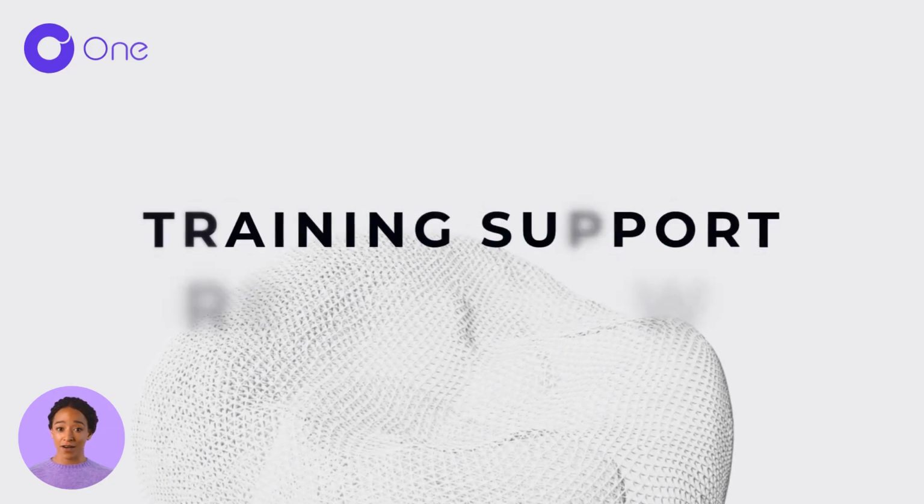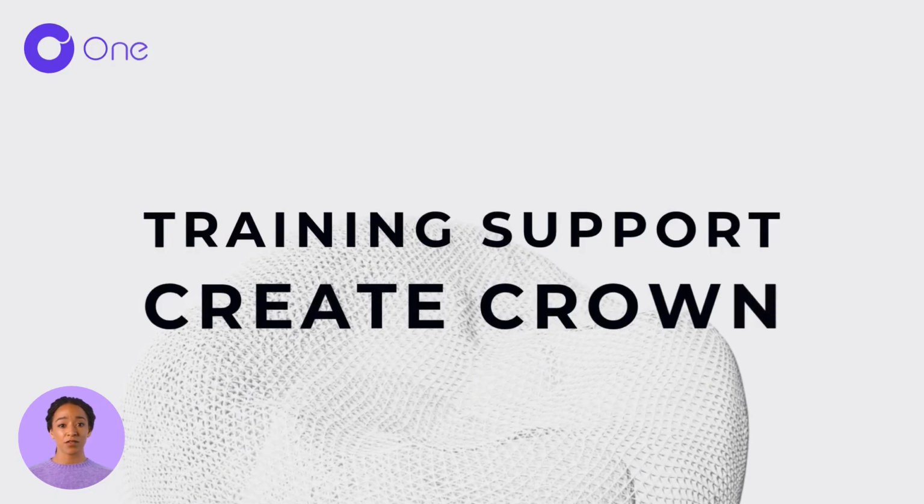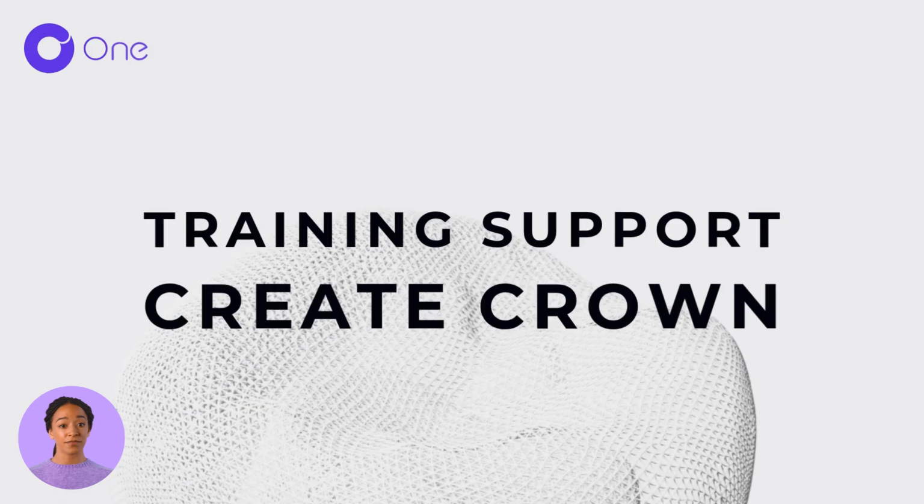Making a chairside crown? It's simple, fast, and intuitive. With Circle 1, we'll guide you step by step.